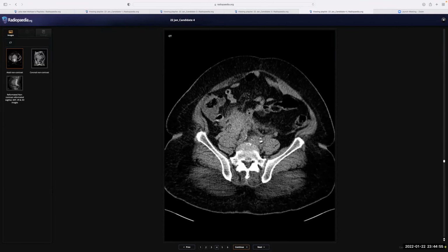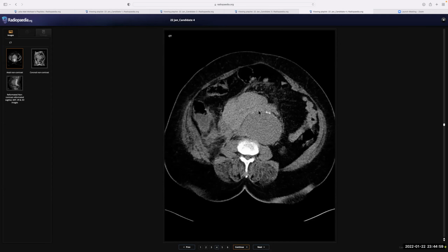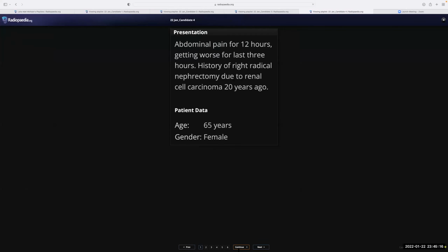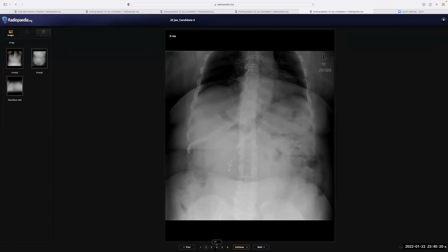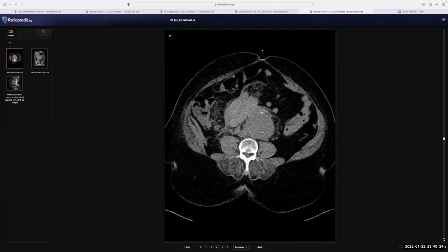Else, I think this is far enough. So you are telling that it is an aneurysm, it is leaking, and the emergency, you will have to pick up the phone and call the vascular surgeon immediately. Yeah. In this, the nephrectomy thing was a red herring. I was consistently thinking about the nephrectomy. Yes, I agree with you. But the nephrectomy was 20 years ago. It's unlikely to be the reason for anything. And you have already spotted the aneurysm. So this is the focus of the study.